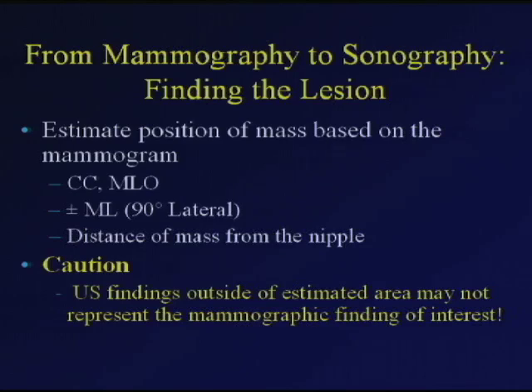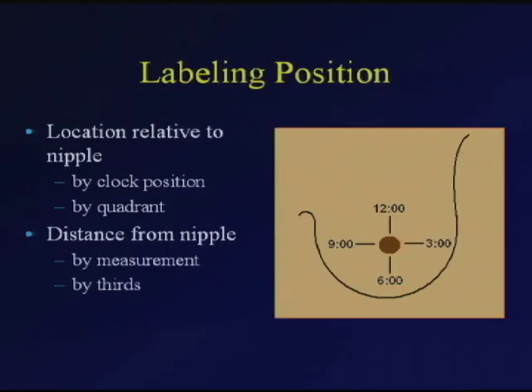But we have to be careful because the estimated area, when we see it on ultrasound, may not actually represent what we're finding on the mammogram. So we have to be very, very careful that the ultrasound finding matches the site of the mammographic finding. Because sometimes on ultrasound you'll find more than what you're seeing on the mammogram, but we have to make sure that we see the mammographic finding on ultrasound as well as anything added.